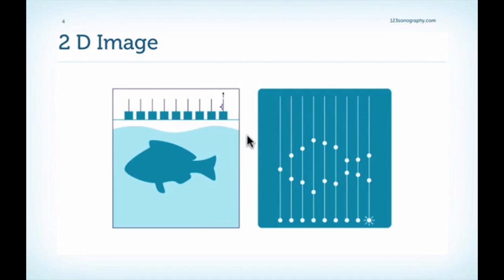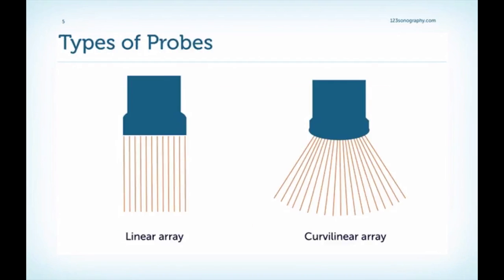Now in a normal image, you will not notice that. It just goes so quickly that you have an entire picture in an instant. But on each boundary, we'll then get a reflection, and that is processed to an entire image.